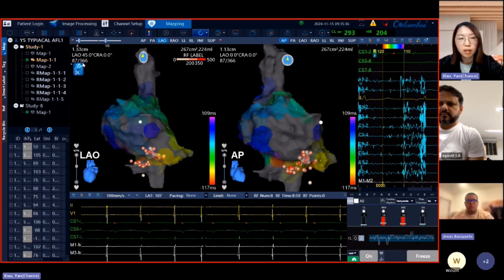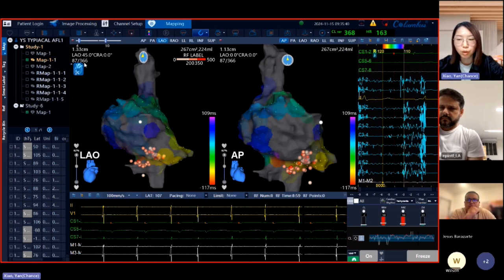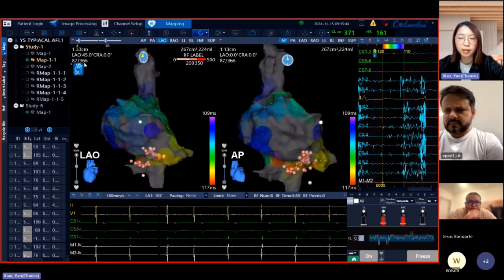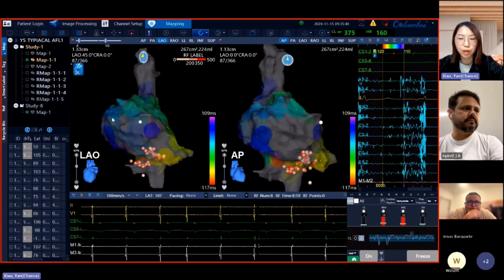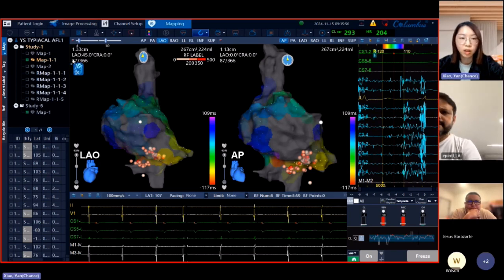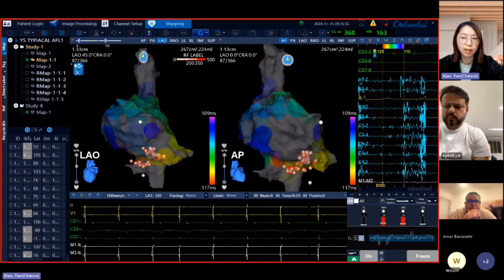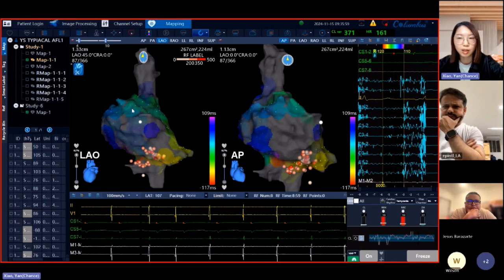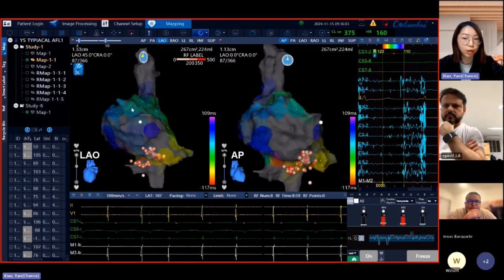points number. On previous version v4.4001, when we collect mapping points over 3,000 projected on the geometry, I mean the points here, if this number is over 3,000, the process will not be smooth on v4.4001.